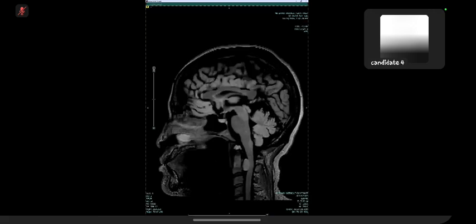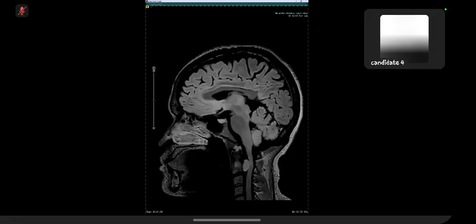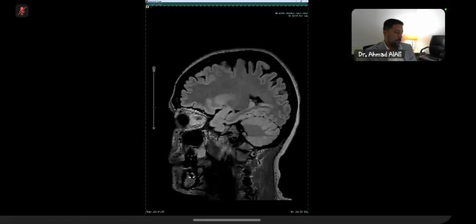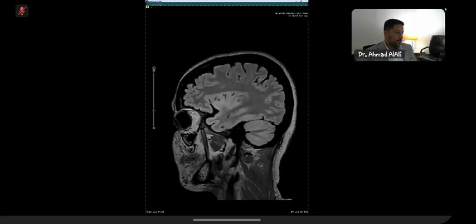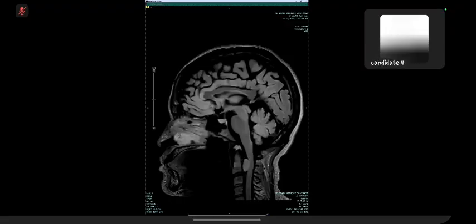There is no obvious pathology. Okay. So let me show you something in here. I want you to search for a pathology in this image. Can you spot anything?